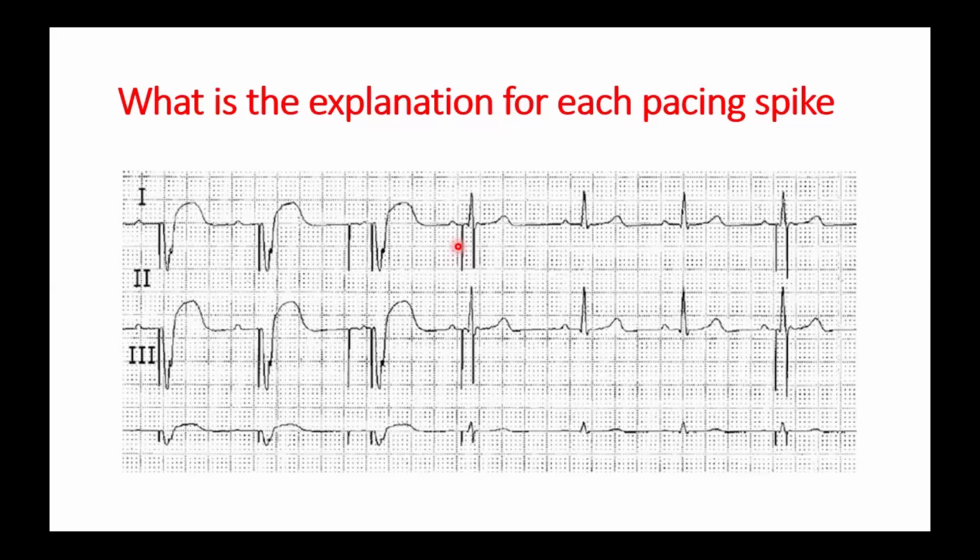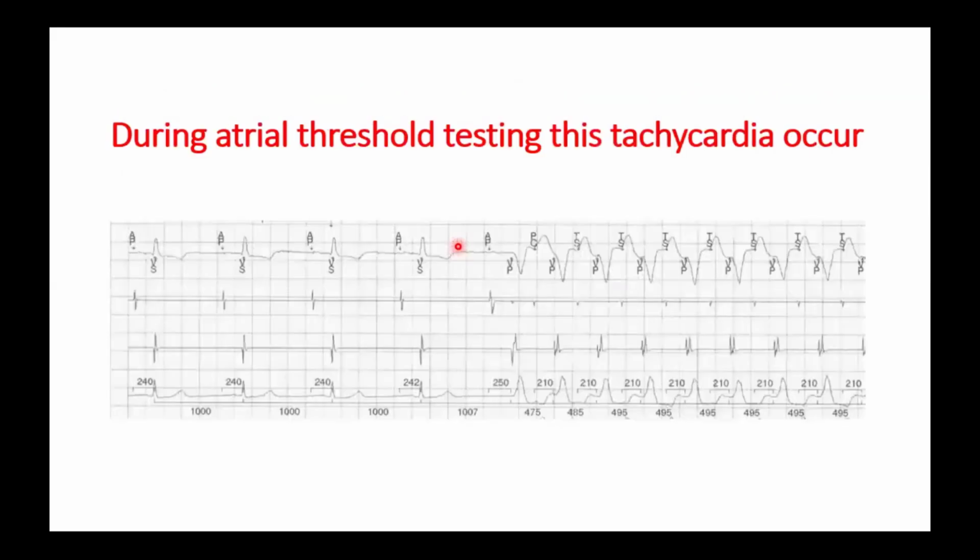Well, next example. Okay. This was noticed during atrial threshold testing. This tachycardia occurred.